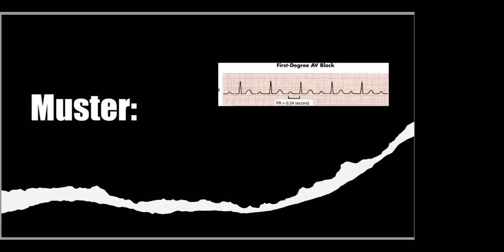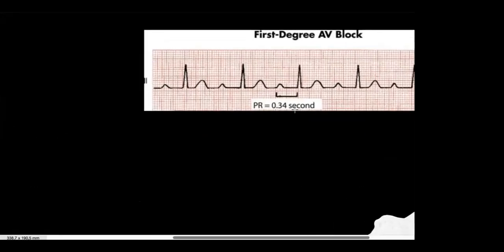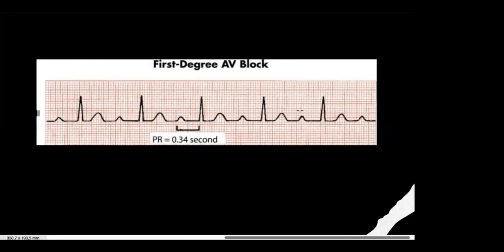Zoom it. Right. As you can see, depicted on the screen is lead 2. This is lead 2, and we can see there is a P wave. Then can you just point the start of the P wave and point at the start of the QRS complex, right?